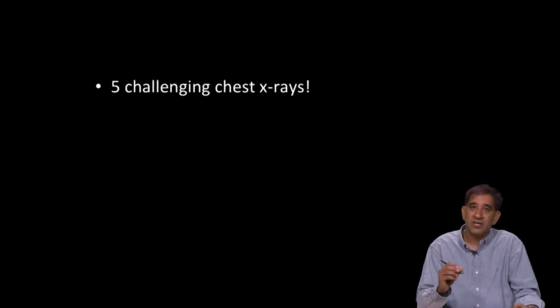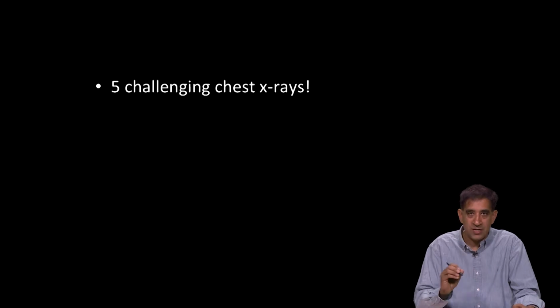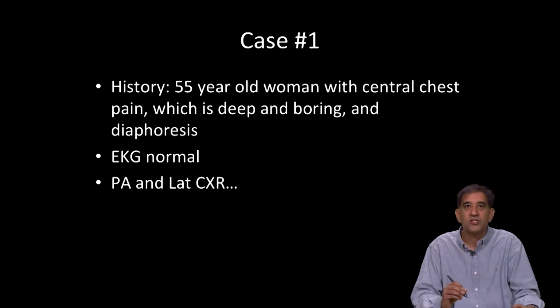First thing I want to tell you is I'm going to go over 5 cases, and they are very, very challenging. These are not going to be easy, so it's going to be very important to look carefully at the images to try to make the diagnosis, and I know you can do it. So let's start with case number 1 and a little bit of brief history.